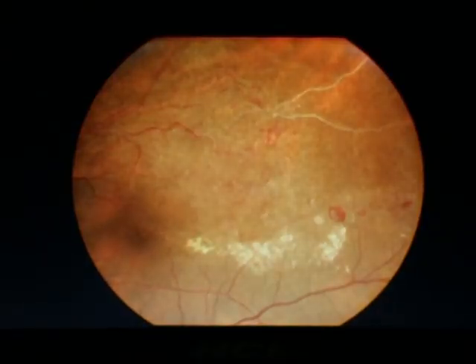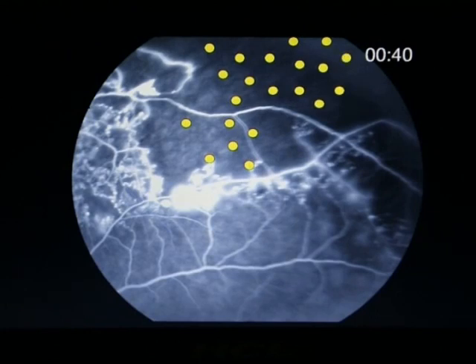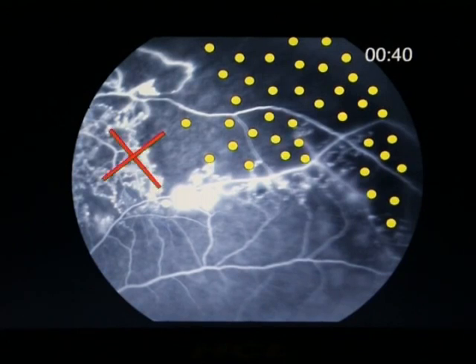Branch retinal vein occlusion is the second most common retinal vascular disorder after diabetic retinopathy. When complicated by vasoproliferation, a scatter pattern of sectorial laser to the ischemic retina is applied, similar to diabetic PRP, taking care to avoid treating collaterals.